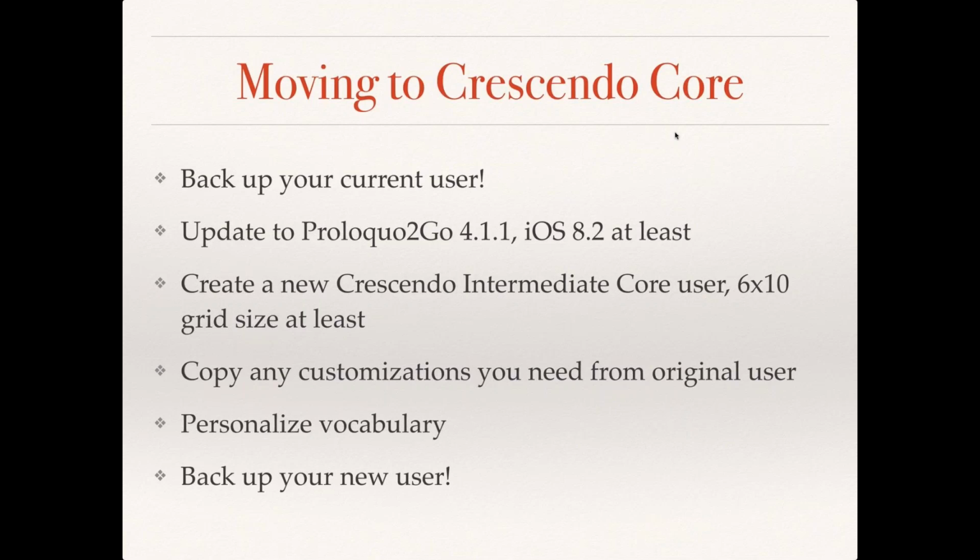And then the latest iOS version, the version of your iPad software, that latest version is 9.1. But if you have iOS 8.2 or later, you should be okay.